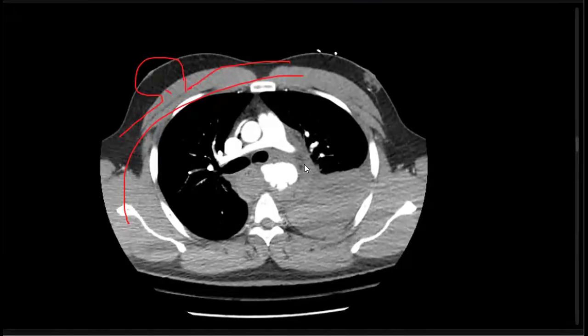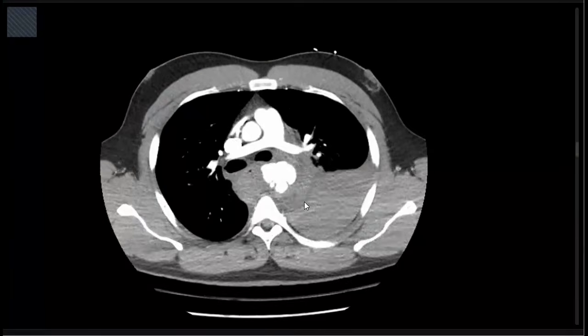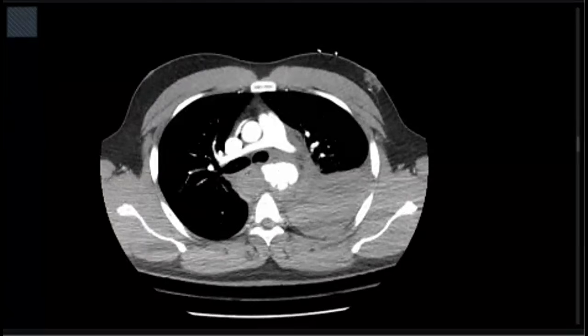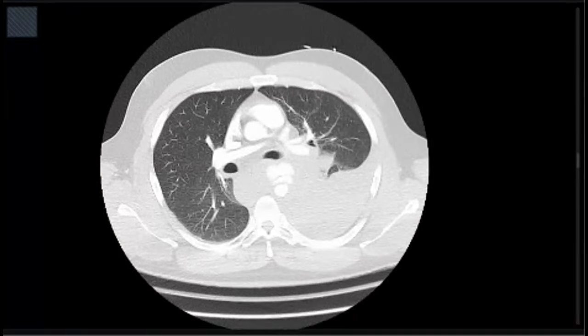So it is a pseudoaneurysm with large mediastinal hematoma and left hemopleural effusion with hyperdensity, likely to be blood. I will check the lung window for any associated pneumothorax or lung injury, and urgently refer the patient to the cardiothoracic team for surgical management. Okay, this is a safety case.